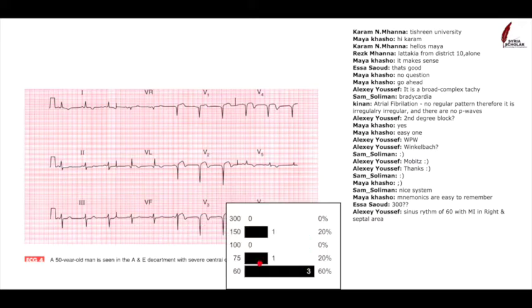So we've got some answers. People are saying these things. Again, let's add them up. We've got 1, 2, 3, 4, 5, so about 5 big squares between each QRS. It's around 75 to 60, so that's about 60 beats a minute. This one's about 4 and a bit, so it's roughly somewhere between 60 to 70.